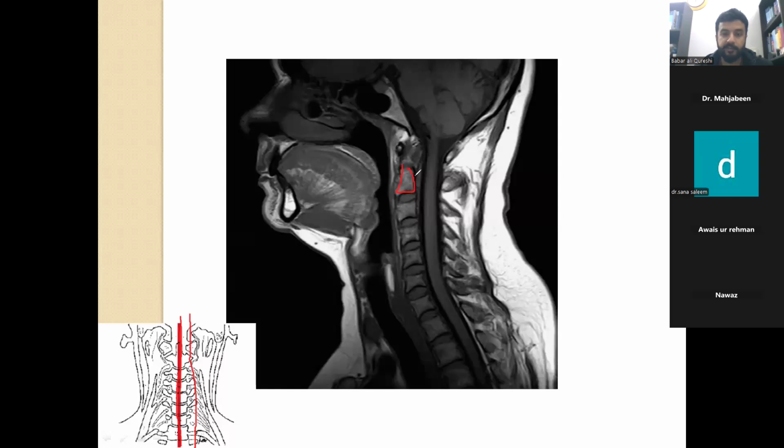In the rest of the cuts, we'll see a bit of haziness that signifies these are taken either from the right side of the vertebral body or from the left side. Similarly, the spinal cord can be clearly seen here. In other pictures, it will start disappearing, meaning that would not be taken from the very center cut.